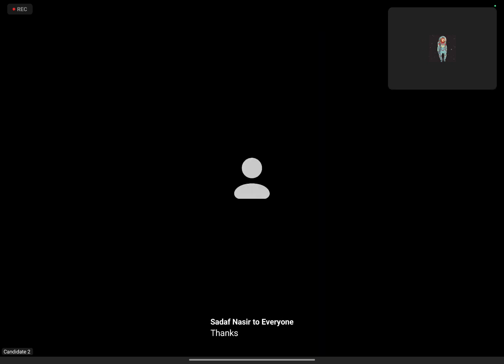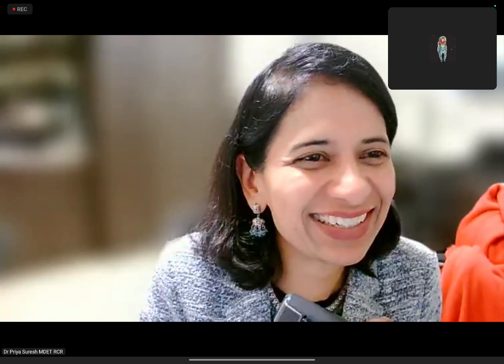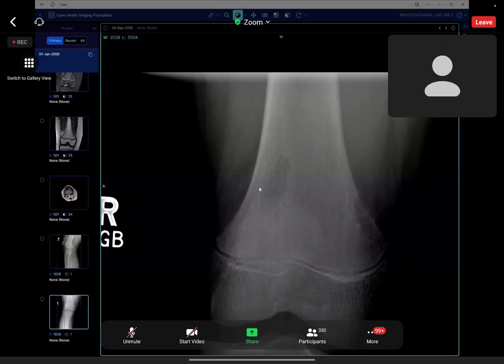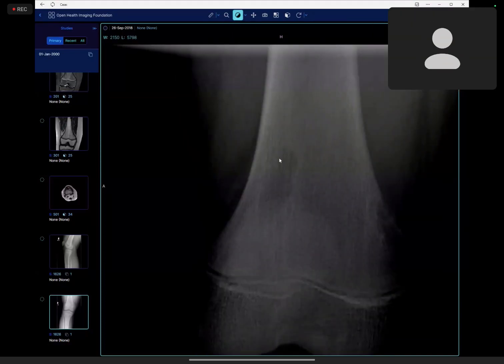I think your screen is not shared. Oh no, that's because I stopped sharing, isn't it? Yes. So let me go back. I've been zooming and trying to show you and everything. Window, advanced share. Am I sharing now? Yes. Okay, fine. So if you see, you can draw around it, right? You can draw nicely around it. Okay, so it's well defined.